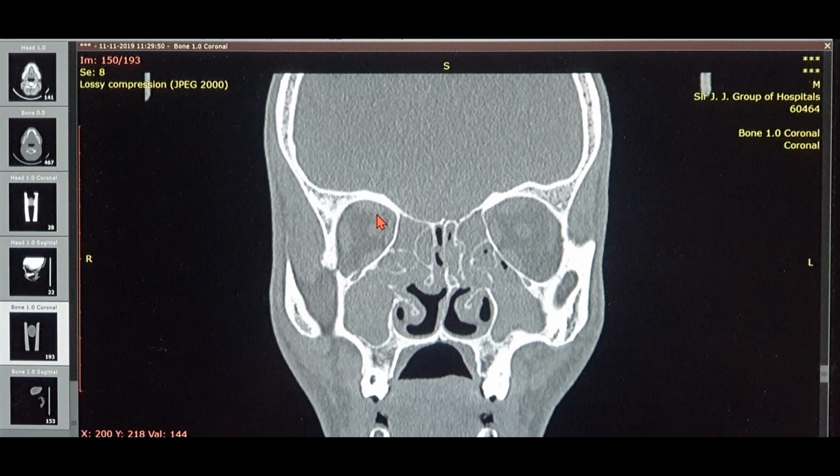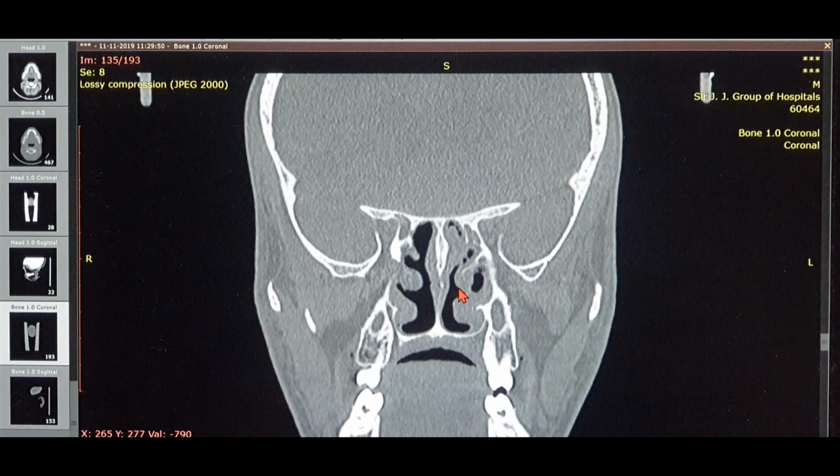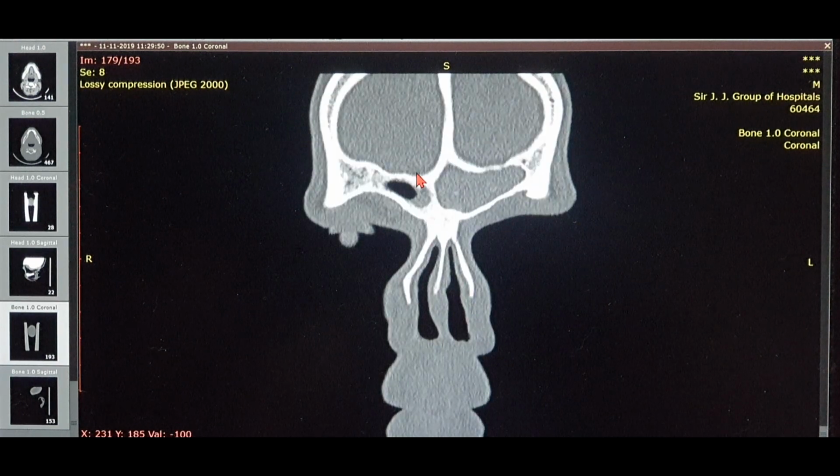Second thing is that the examiner directly will point out any specific anatomy on the scan itself and will expect you to identify that and give the answer to it. So in the next 5 to 10 minutes, I'll run you guys through the basic anatomy of the CT scan PNS. So listen to me very carefully. So the CT scan is always read, this is a coronal view, from the anterior to the posterior aspect. So I'm going to start from the most anterior aspect right here.